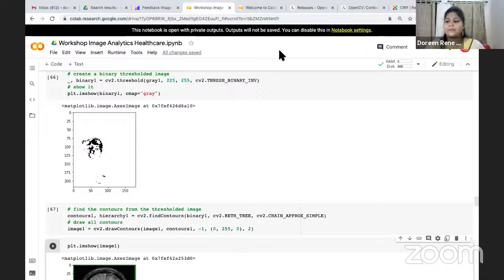There's a difference between edge detection and contour detection. Edge detection carries out for the entire image, but contour detection only for objects present in an image having the same color intensity. Most of you get confused between contours and edges. It is not the same. Because the researchers you work with are detecting objects, right?